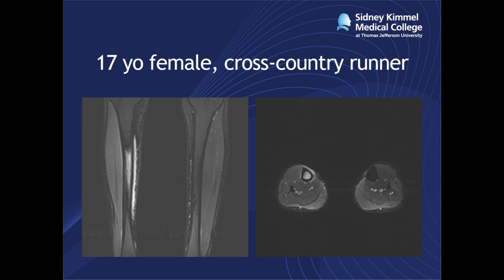I think we have to be very cautious and cognizant in making sure that we categorize these appropriately. In something like this, there is a very severe stress response, and we would have to consider the fact that there might be a stress fracture here. Sometimes the field of view, especially for something like a tib-fib study where the field of view is relatively large, makes it difficult to clearly identify a fracture. Sometimes there's motion that makes it a little bit difficult. But especially with stress injuries like this, you want to make sure that we put these in the proper categories so that the patients are given the appropriate time to heal and to prevent any complications from them coming back to activity too quickly.